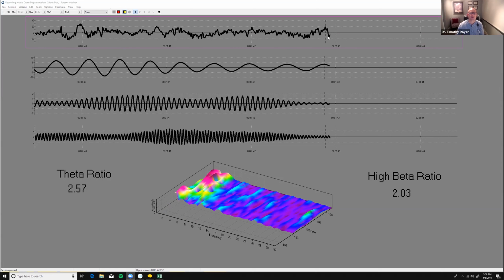This is a really good representation of what we've been talking about. So you've got your raw signal here, which is a synthesis of all the different frequencies. And now we've got it broken down into, this is a 2 hertz frequency. This is a 16 hertz frequency, okay? And this is a 30 hertz. Now remember, all these things come together, 1, 2, 3, 4, 5, 6, 7, all the way up to 32, into this guy. He's the combination of that.